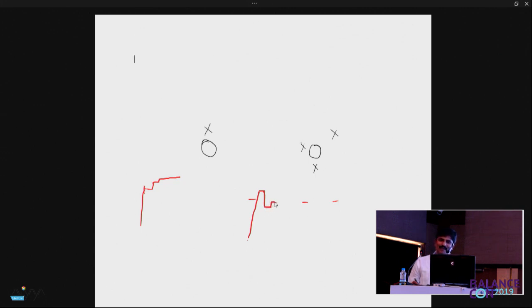Then only it comes back. So there is an oscillation. In hypometria you see steps, in hypermetria you see oscillations, around the point at which it is supposed to fixate. That is the first picture, A. Can you make out that in the book? Yes. That is from the Z book, Leigh and Zee, Neurology of Eye Movements.